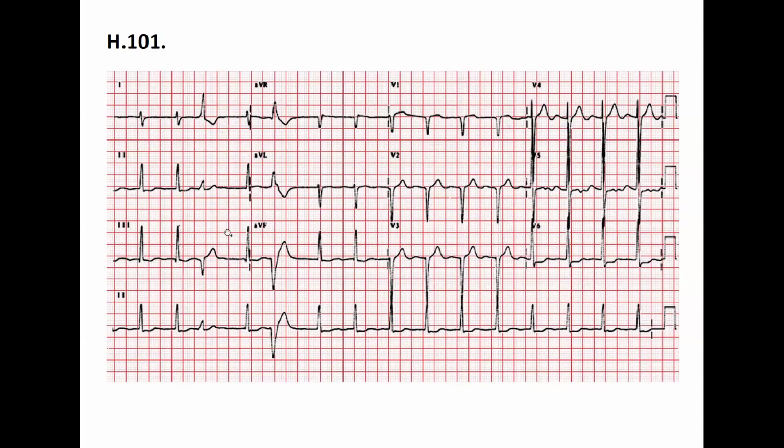All right, so let's solve this ECG. It looks like an irregular rhythm. So basically, based on the rhythmicity, it is irregular. But you do see this mostly rhythmic.